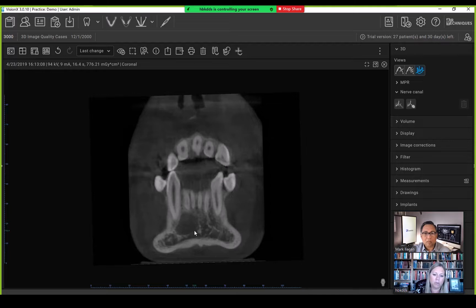And our number two would be an odontogenic keratocyst. So those would be our differential, and we would go ahead and recommend a biopsy. But again, the surgeon's going to know immediately once he gets into that which one it is. Okay. But my bet for this age group would be our simple bone cyst or idiopathic bone cavity. Okay. So we'd go ahead and write that up.